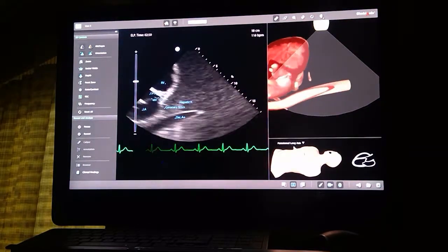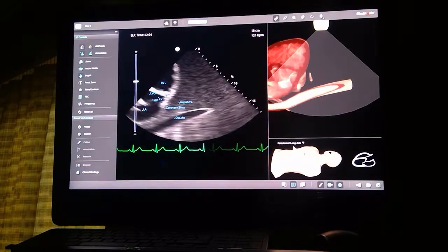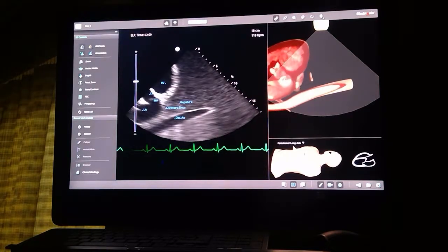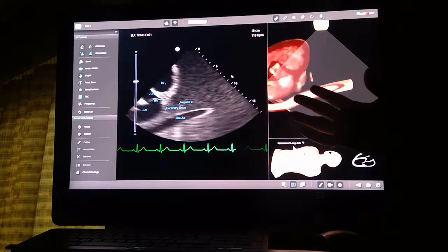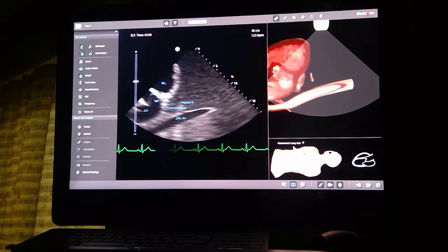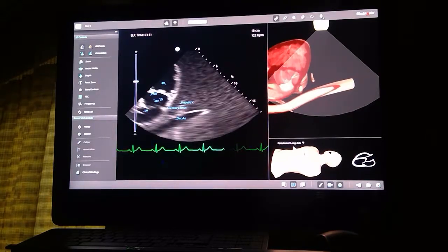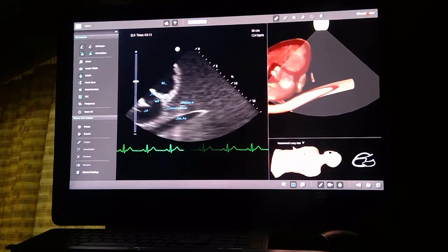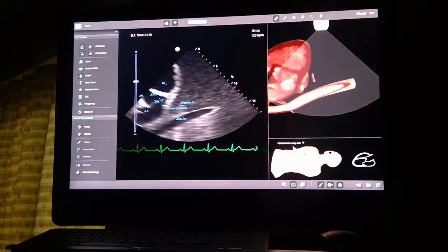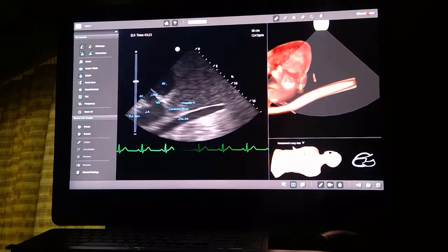So all in all, if we want to sum this up, this is the patient who came in after a long flight, has been having leg swelling, shortness of breath, hypotension, tachycardia, and with all the signs that we see on echo, RV strain, we have high pressure in the right atrium, right ventricle, IVC dilated, and the septum is bouncing towards the left. This is most likely a DVT that led to a pulmonary embolus. We cannot see the embolus on the echo, but we can see signs of increased pressure.